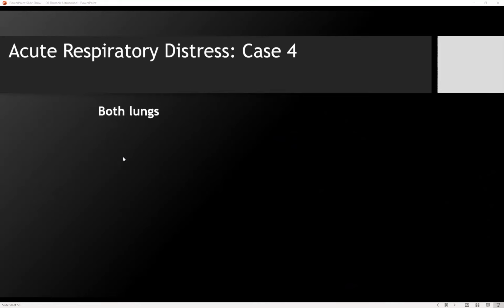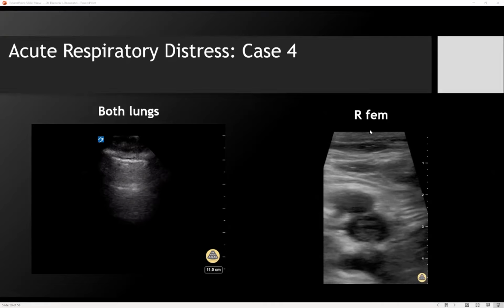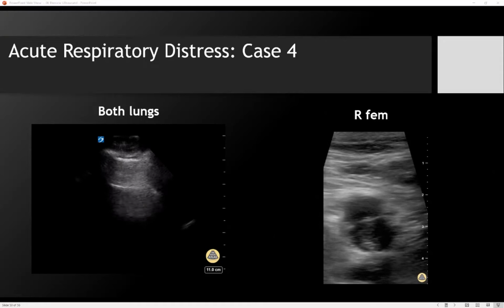Okay. Helen, can I give you this case? You have a patient, and case number 4 in both lungs. This patient has this finding, which are... We may have lost Helen, so anyone else can pipe up. She doesn't have a mic. Oh, that's right. A-lines. Oh, normal. Sorry, thanks. Forgot about that. And what do you have here? Sorry, I put you on live chat.